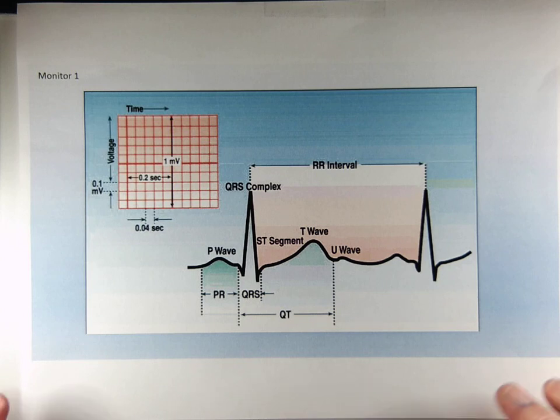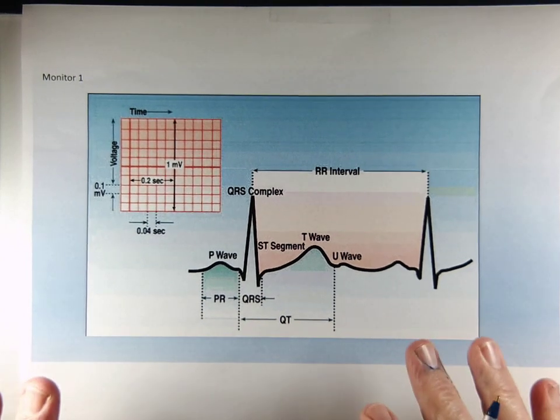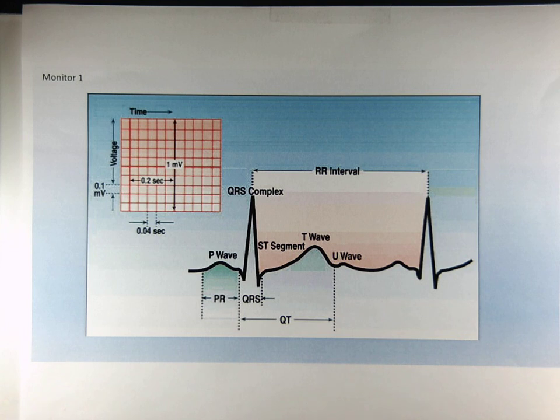All right, we're going to talk today. I want to do a few small, short talks just on the basics of EKG, because I think that was part of the problem that we never got a chance to go over. So the first thing I realized is, just looking at the paper, what does it mean? Why are there lines on it?